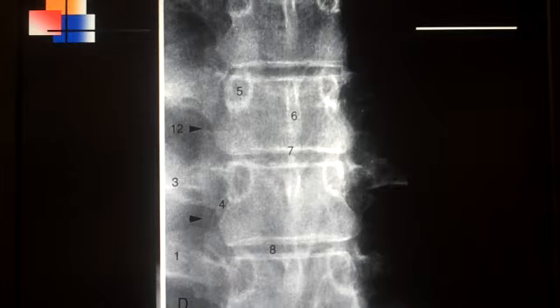Looking at number one, when I look at number one, I have the rib that is right here. All of this is the rib. Number two, which is not on this film, but yeah, there it is. Number two is out on this transverse process right here, so this would be TP. This out here, again, is a rib coming into that transverse process.